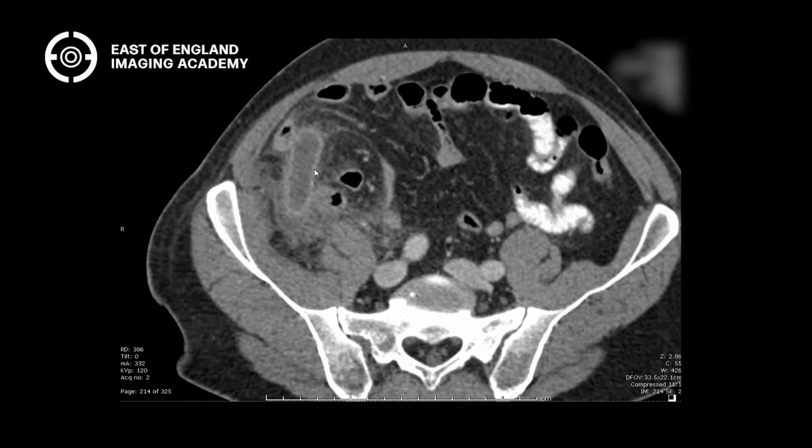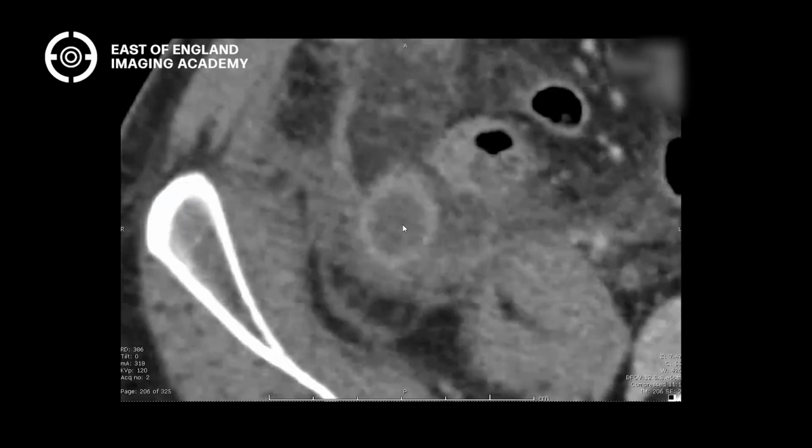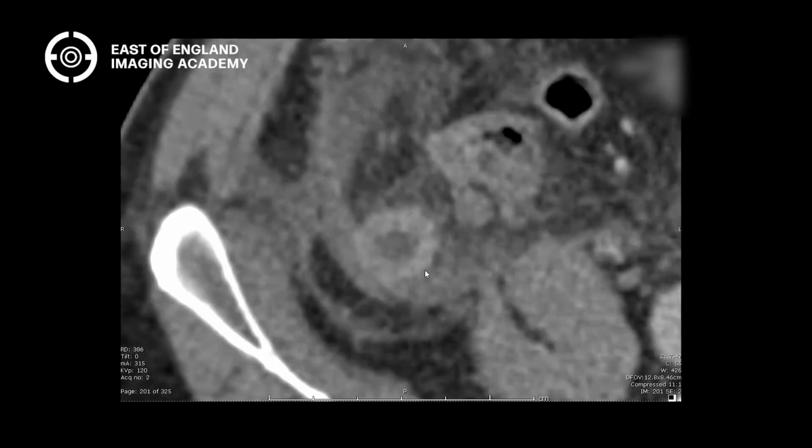So beginning to put all the stuff we've been talking about together, right? You've got appendicitis, but let's have a look at the appendix and follow it into the cecum. So you can see an enhancing wall, enhancing wall, enhancing wall, thickened enhancing wall, thickened enhancing wall, and then what happens to the wall? Where's it gone? Yep. So it could be perforated, or it could just be ischemic, couldn't it? Exactly. So we've now not only said this is appendicitis, but we've now upgraded that to gangrenous appendicitis.